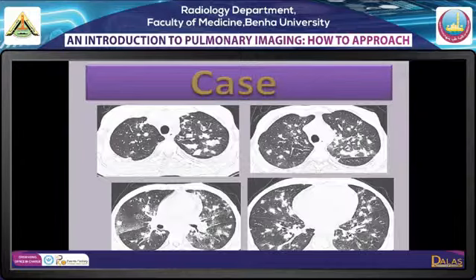لو انا بتعامل في حتى انديميك، الكابوزي ده بيبقى فيه سبوراديك كيسز وانديميك كيسز وابيديميك. الانديميك ارياز زي سنترال وايسترن افريكا، ده انديميك كيسز. عيان بيجي برضو للعيانين الترانسبلانتيشن ده الياتروجينيك تايب. يبقى لو عارفه ان عيان ترانسبلانتيشن this is one of the complications اللي هقلق منها المنظر ده. عيان جاي من انديميك اريا، عيان باميون كومبرومايز سبيشالي لو ايدز او عنده هيربس انفكشن. فده العيان اللي لازم ابقى قلقانه من this possibility مع التيبيكال 4 حاجات اللي قلناهم دول: bilaterality, flame shape, pleural base, ground glass opacification and prominent interlobular interstitial. كده 5.